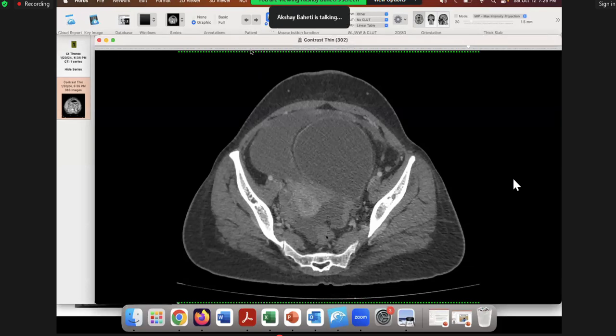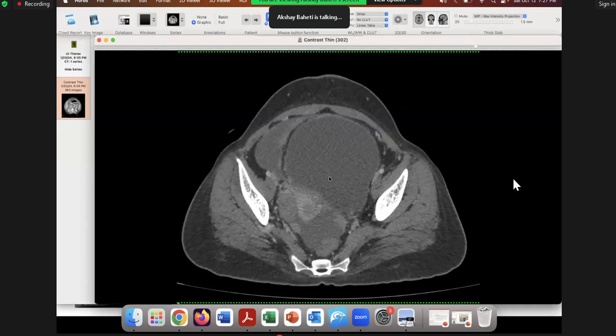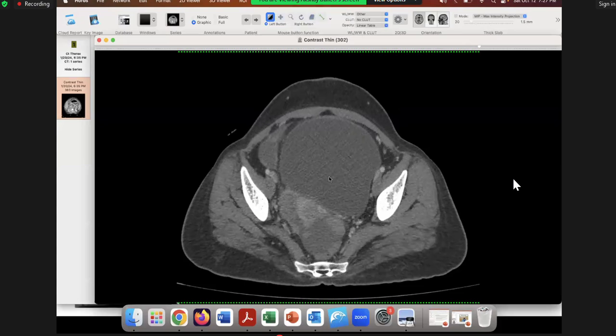No. So Sameer has answered it. It's 80%. So more than 80% solid tissue is solid. Okay, then below 80% solid becomes cystic with solid components. So if you look at O-RADS, now they say you have to call it cystic with solid component rather than the word solid cystic. That's something you should avoid using. But many people still end up calling it solid cystic. I don't make any judgments based on that.